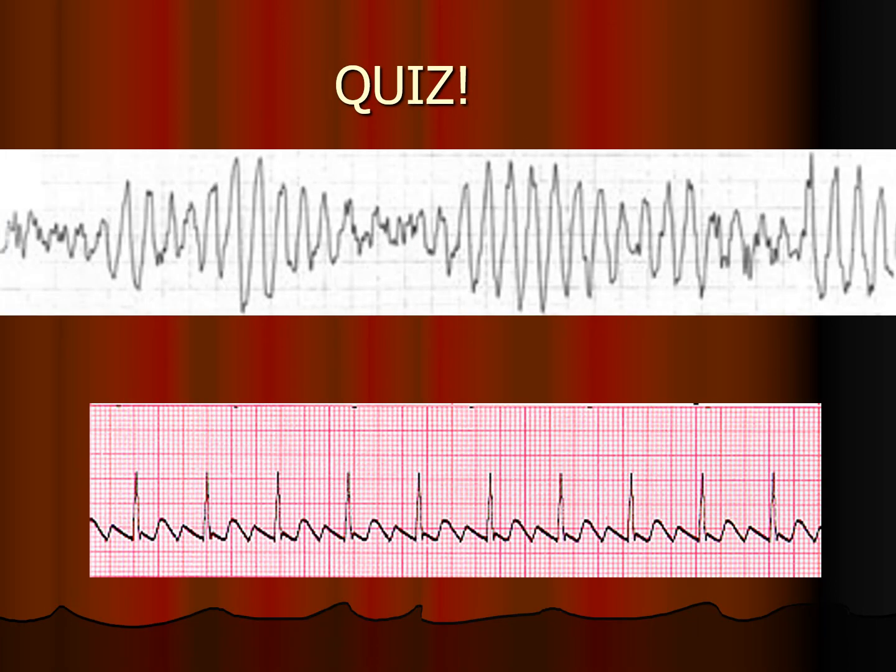All right, quiz time. At the top, this one is our pretty textbook torsades de pointes, right? The R to R's are the same if you were to count them out, but the amplitude changes, and that's torsades de pointes, okay?